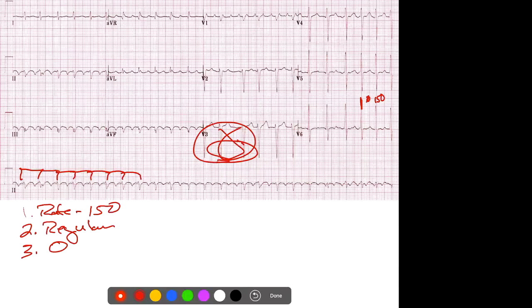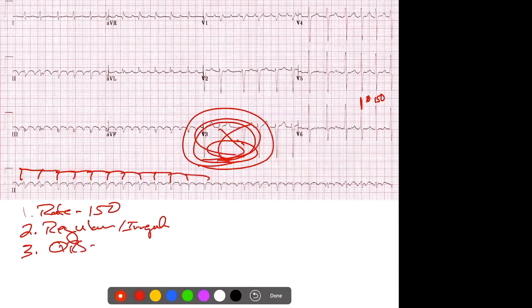Well, you can, and even with this rhythm, it would be okay to say it's got some irregularity to it, because this rhythm can fall into both categories. There's a little irregularity there, maybe just because of a slight fluctuation in the ventricular rate, but for the most part, this is a pretty regular rhythm. Mr. Roberts, can I pause you right there? Sure. Your textbook says it's regular, irregular. You're saying it can go regular or irregular, but tomorrow is going to be multiple choice, A or B, regular, irregular. Which one are we going with for a flutter?